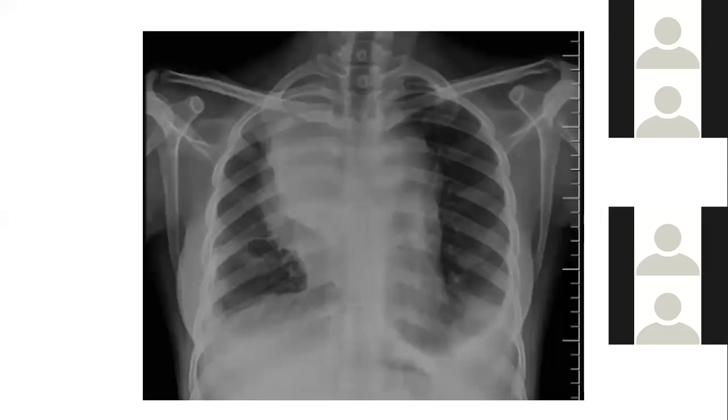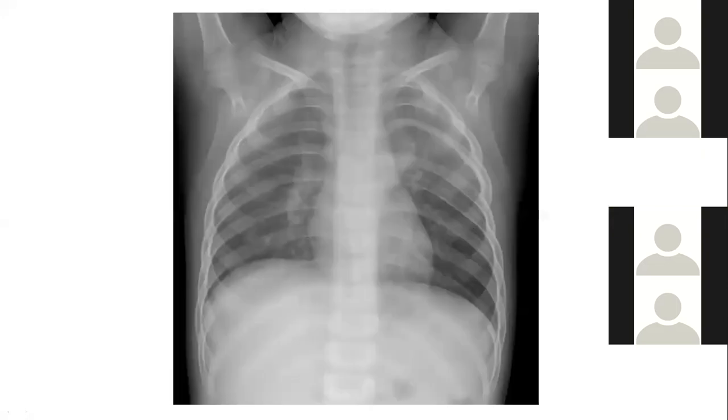So based on this, again, we cannot make out in this particular X-ray the arch of aorta, neither the cardiac margin. So this is an anterior mediastinal mass, at least this particular one, right? So based on the Silhouette sign, we can further localize into which mediastinum it belongs. Other than that, there are many other signs which we'll discuss again.